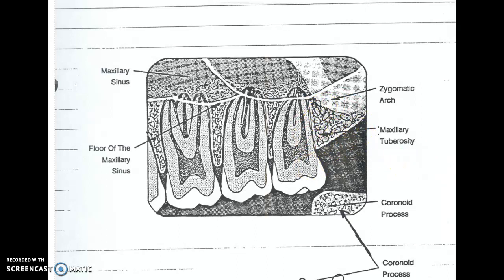And then one of my favorite questions, the DANB likes to ask this question, the Dental Hygiene National Board likes to ask this question: what is the only mandibular anatomical landmark that you might see on a maxillary periapical? Well, if you have your vertical angulation correctly, you shouldn't see anything mandibular on a maxillary periapical.